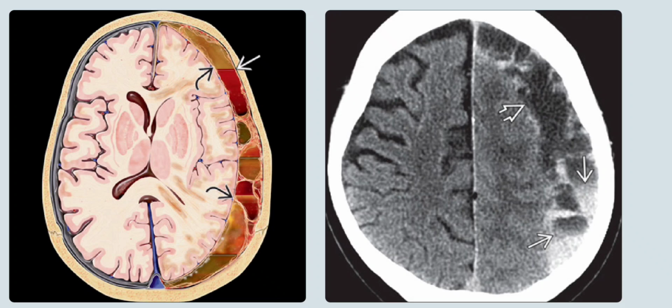Numerous loculations that contain hemorrhages of multiple ages are present. Note the fluid levels with mixed acute and subacute blood. Re-hemorrhage into the pre-existing subacute or chronic subdural hematoma is quite common.